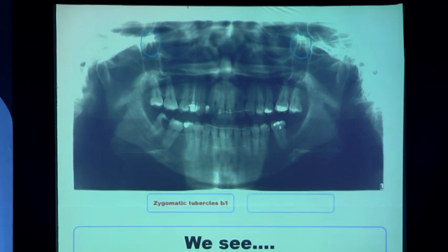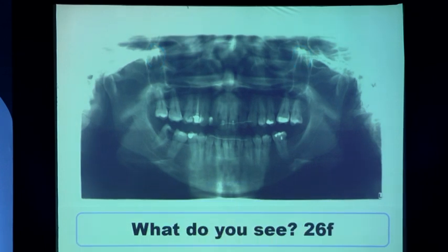Okay, this is the patient. This patient had, okay, this is the initial radiograph. Look everywhere. There's a pointy thing here. Both sides, you have two spikes. You see it or no? You see the pointy spikes? What region is this?